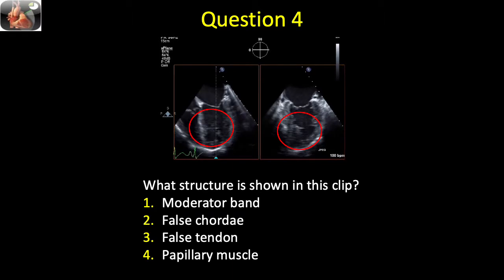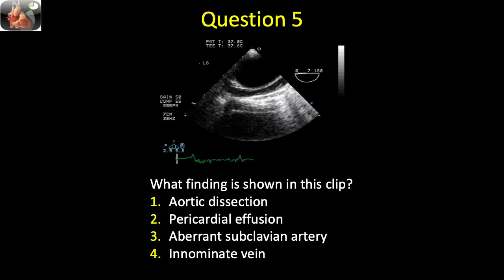Question 4. What structure is shown in this clip? Question 5. What finding is shown in this clip?